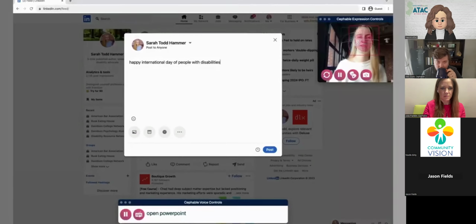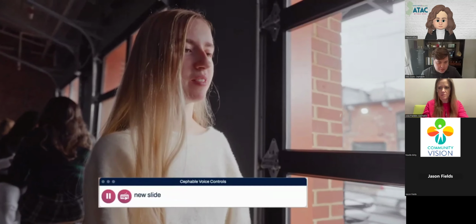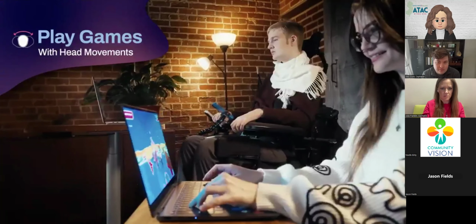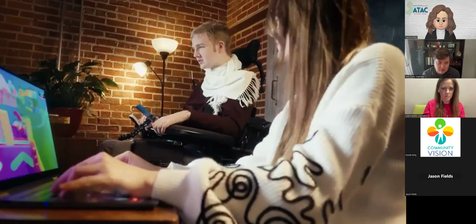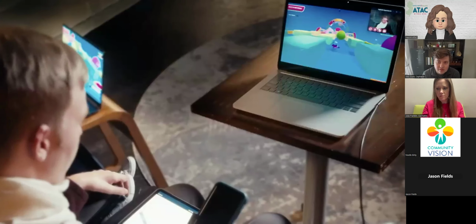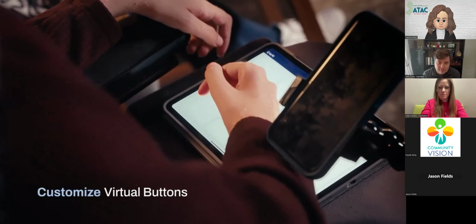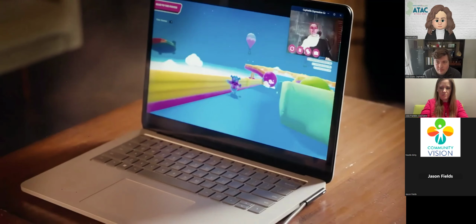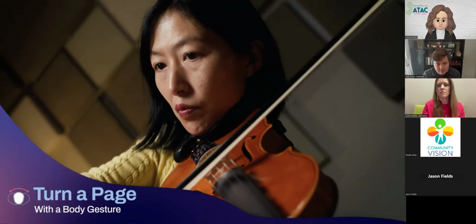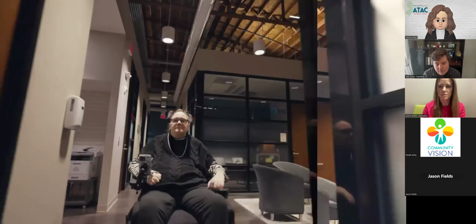Open PowerPoint. New slide. Scroll down.